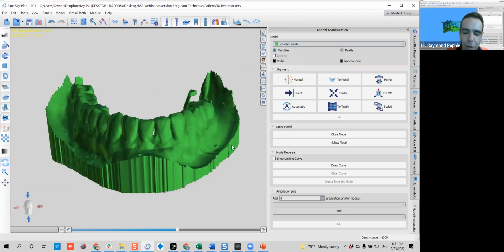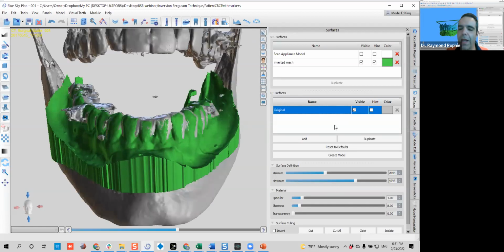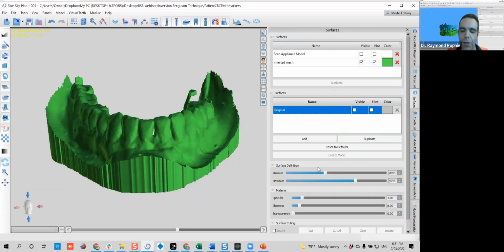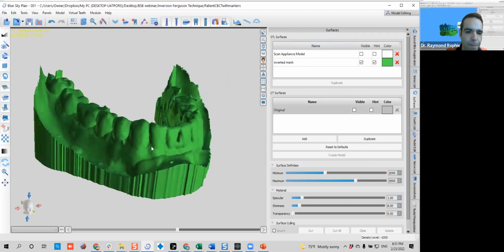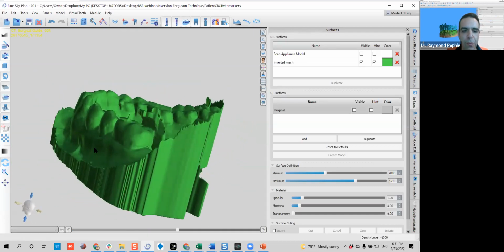This will remove the CBCT and will also save you a few seconds and will allow you to focus more, not having to go to the surfaces panel and then to the CT surfaces and then to click or allow the visibility or not of your CT. Okay, again, here on this third button, rendering out, rendering in, it will allow your CBCT to turn on or off. Okay, so I will show you how to clean these models.